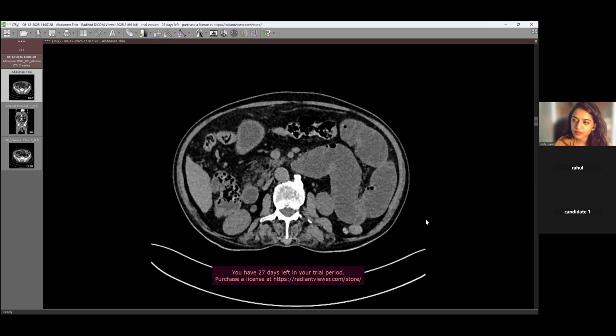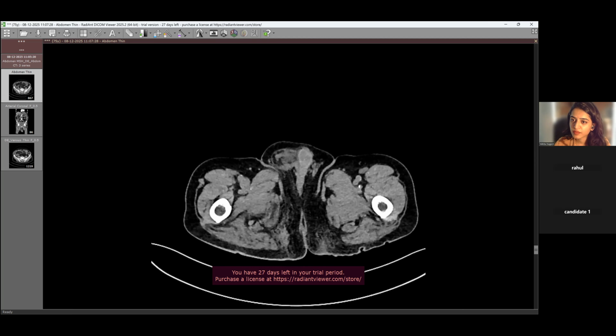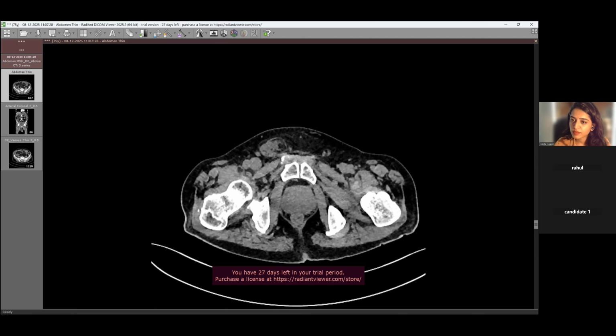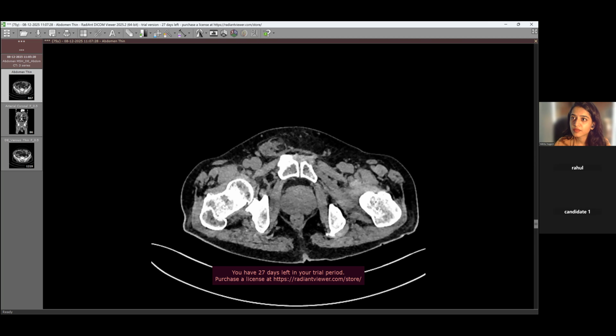And did you mention the type of hernia here? Yes, I said inguinal. So when you say it, you can give the differentiation with the pubic tubercle or the compression of the femoral veins. You can give the substantiating points to show that you know what is going on to differentiate between the two. And did you say spinal cord compression? You said you have told, right? Yes, in the other case, yes.